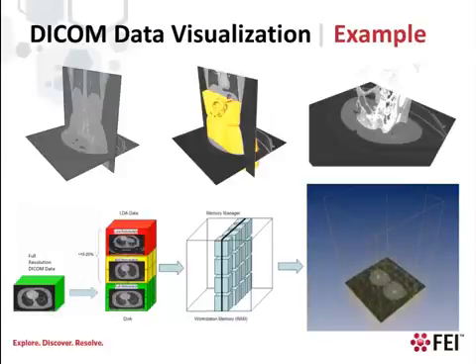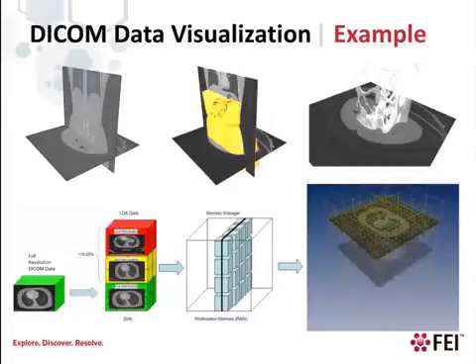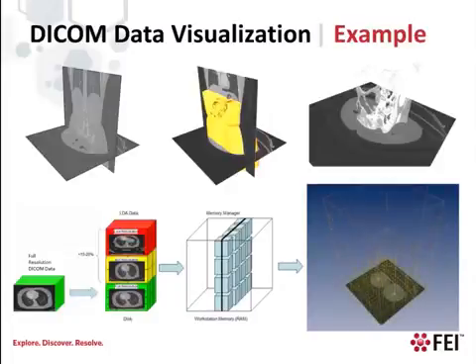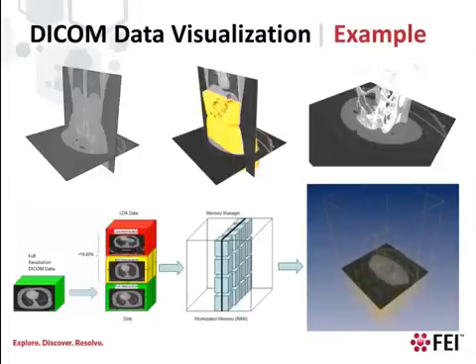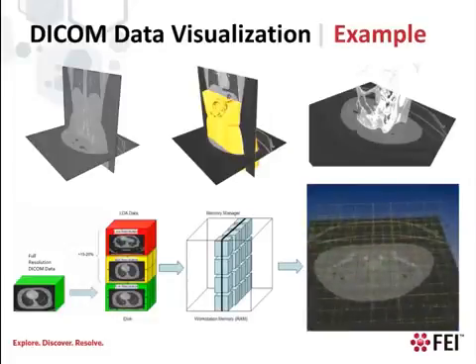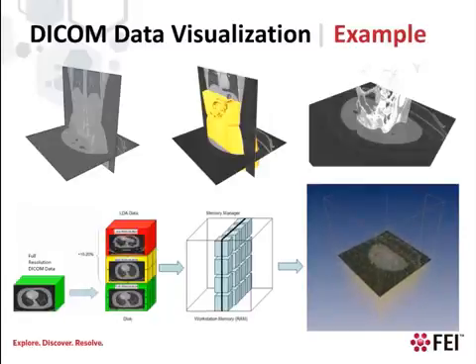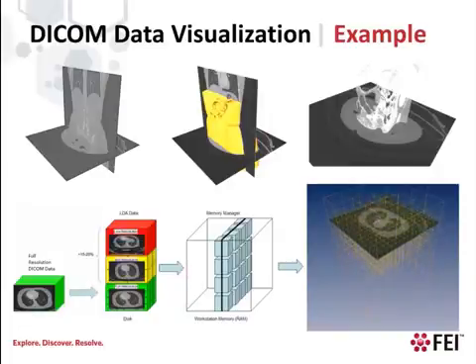The Volume Viz solution includes a hierarchical multi-resolution large data manager called LDM. This technology allows rendering of very large datasets and multiple datasets with reliable interactive navigation, even on machines with limited performance and memory. You can see an example here, how LDM manages the most relevant tiles of data in main memory and GPU memory for the current visualization. Volume Viz LDM is used in many commercial applications today and has been stress tested on hundreds of gigabytes of data. It is designed to support up to terabytes of data.